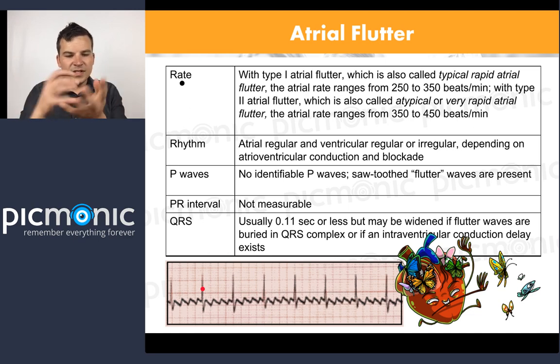Well, if I folded this like origami and cut it and laid them all on top of each other, it's doing the same thing over and over and over. People would be very cautious to call this regular. Well, it's irregular, but it's regularly irregular. It's doing the same thing over and over and over again. So that's regularly irregular.